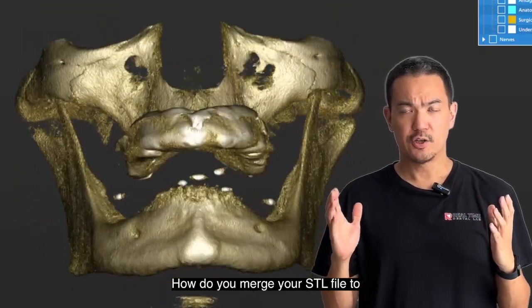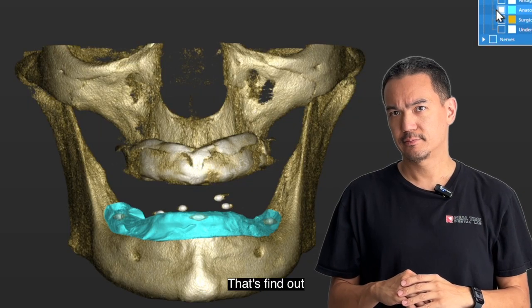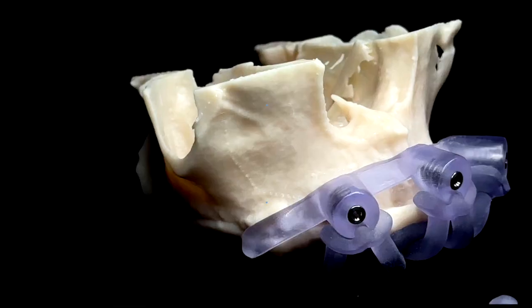How do you merge your STL file to an edentulous patient? Let's find out.